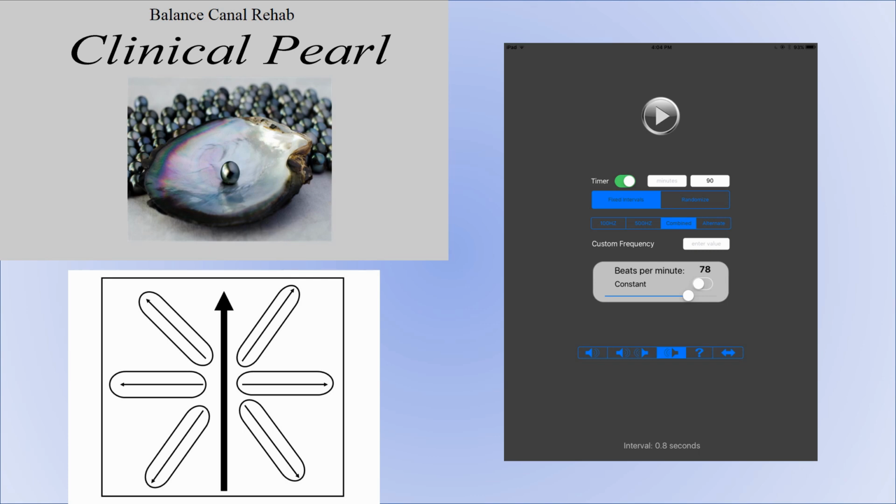As such, its paired left anterior canal is going to be dysfunctional. So we want to set up our Tone Pacer with the 500 hertz tone in the right ear to stimulate the posterior canal on the right, and the 100 hertz tone in the left ear to stimulate the paired anterior canal on the left. We do that by selecting the combined frequency, which, as we stated previously, places tone 2, which happens to be the 500 hertz tone in this example, in the right ear, and also places the 100 hertz tone in the opposite ear, in this case the left ear. So we're going to get a rehabilitation of the canal pair, right posterior, left anterior, which we determined by clinical examination was a dysfunctioning canal pair.